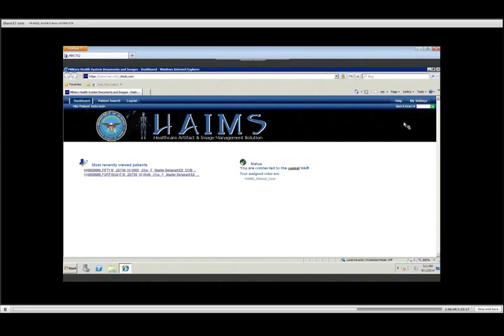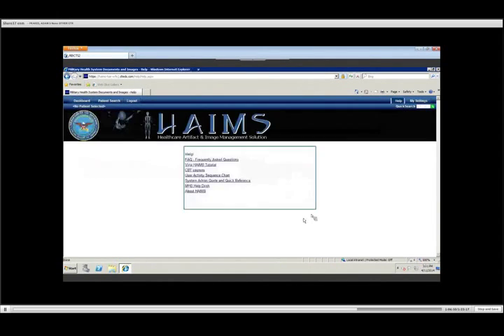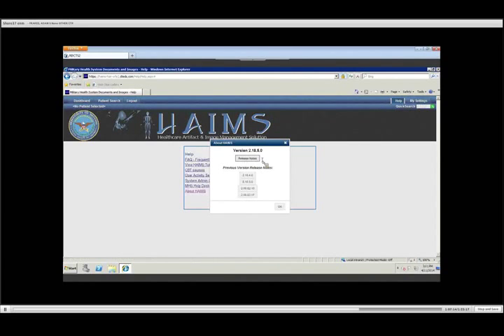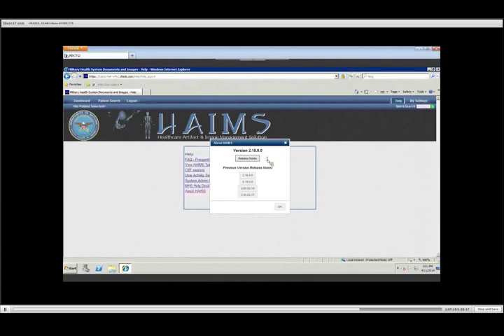So if I click on help, from here, you'll see that there are frequently asked questions that I can click on. There is a HAIMS tutorial. The computer-based training courses, there are some that are loaded here, as well as on MHS Learn. About HAIMS, if I click on About HAIMS, this will tell me the version that I'm working with, as well as where you see the release notes. If there is an upgrade to the HAIMS system, I could click on Release Notes, which would then launch a PDF, and that will tell me what new changes have been made.